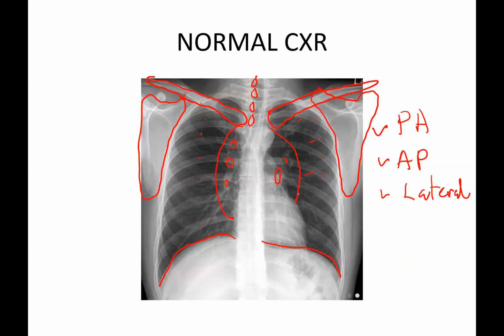They are normal, but in a diseased chest, you might see these becoming significant, and the opacities here will be more marked. So it is very important you differentiate. You can see in this x-ray there is just no opacity. It is not marked because it is a normal chest x-ray.